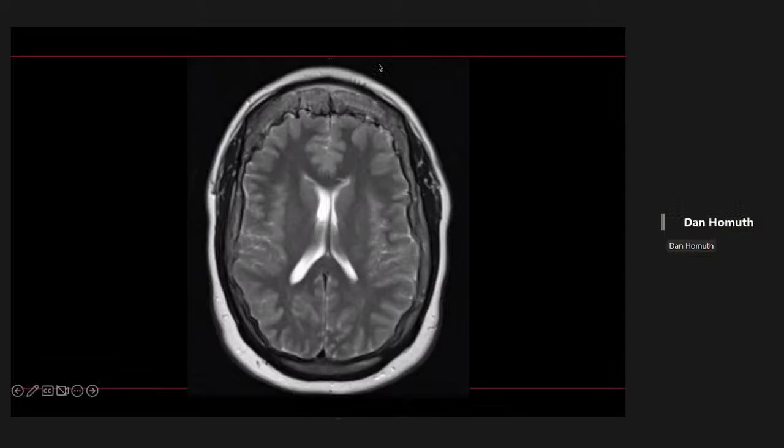Sure, we have a T2 image, and it just looks to be a little bit more lumpy, bumpy in regards to the gyri, as well as the calvarium itself.